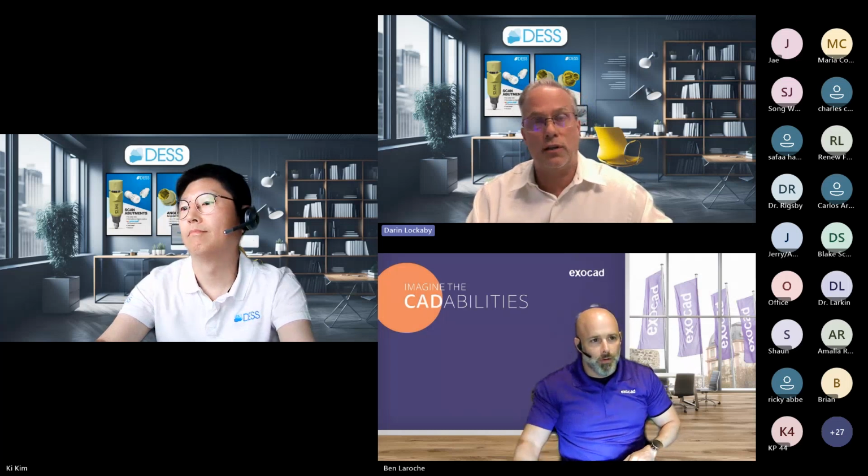Our partners at Medit, one of our partners on the iOS side, provided some information about how to data capture with DESS scan bodies and utilizing libraries to start the process of being able to design and mill your abutments. In today's series, we're going to focus on the CAD portion of the PNP process.